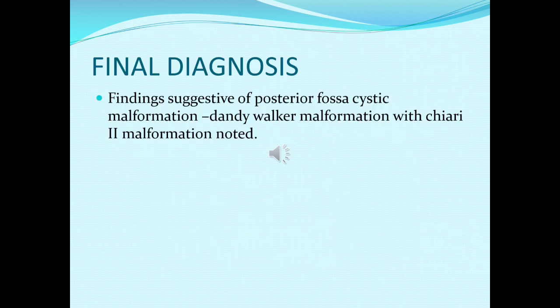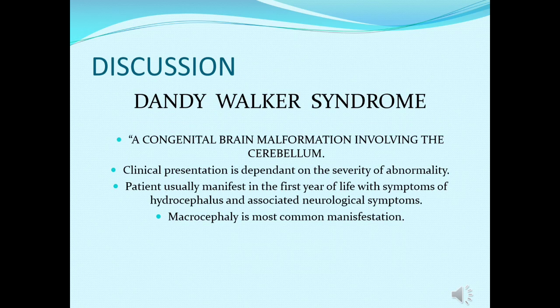Findings suggestive of posterior fossa cystic malformation, Dandy-Walker malformation with Chiari 2 malformation more likely. Discussion. Dandy-Walker syndrome is the most common posterior fossa malformation. Clinical presentation is dependent on the severity of the abnormality.